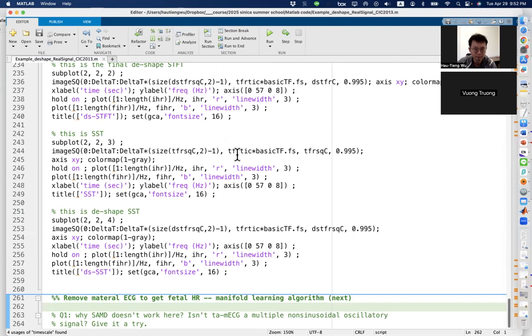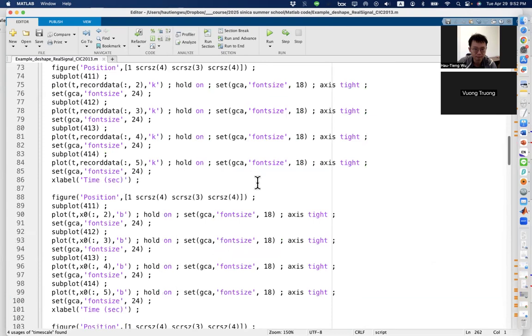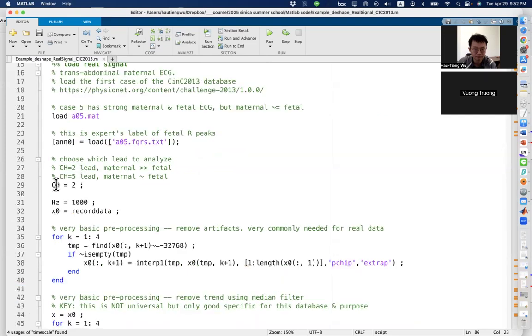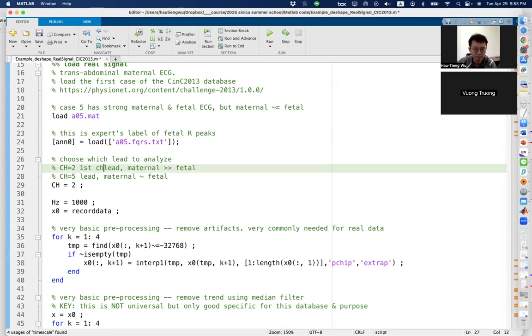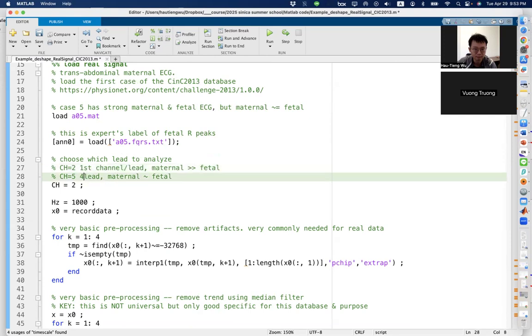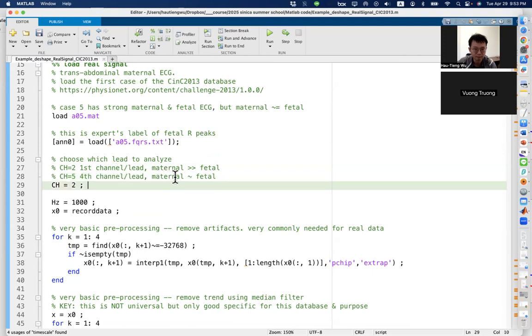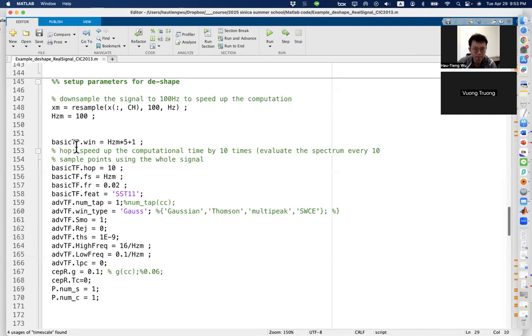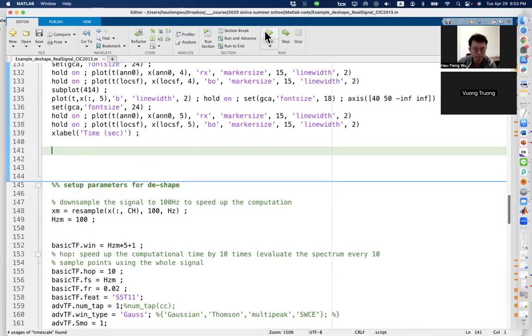Okay, good. So now we have seen the second channel, but technically it's the first channel. I should say first channel or lead. Okay, so this is the fourth channel, or lead. Now, in this case, as you remember, I showed you before, the maternal strength and the fetal strength will somehow be similar. So let's see what we get. And this time, let's run everything at once, and then we can take a look together. Okay, so run.